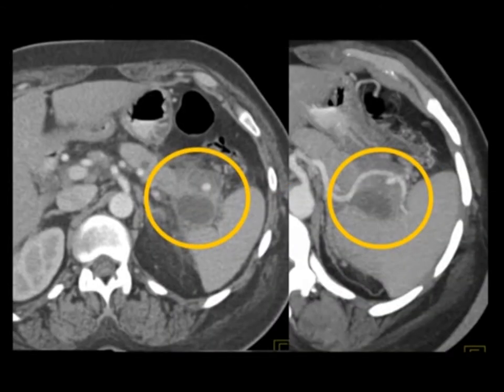When you look at this example, again, small pseudoaneurysm, and you can see that part of it has been thrombosed. You can see that part of it seems to be walled off. But again, these are the ones, although it's small, can be very problematic, can easily rupture, easily bleed, and whether you embolize or resect, something needs to be done. It's not your basic leave-alone lesion.